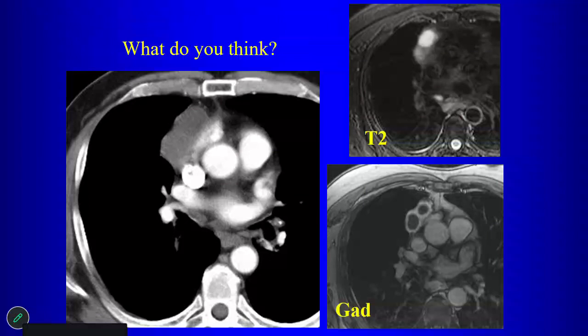So what's different about this? There is rim enhancement, right? There's thickening of the wall, and this is also multiloculated, right? So can we say that this is a simple thymic cyst? No, in this case we don't. So in this case we can worry about neoplasm.